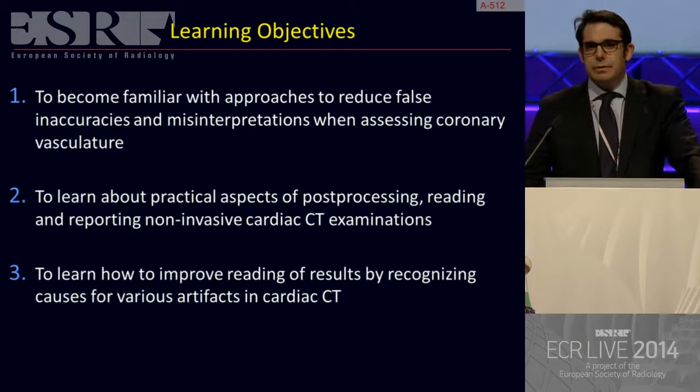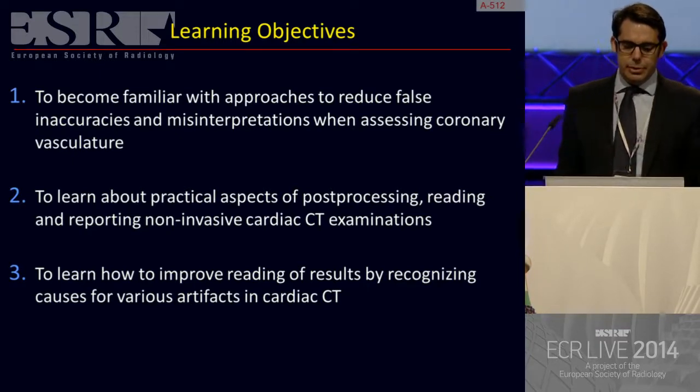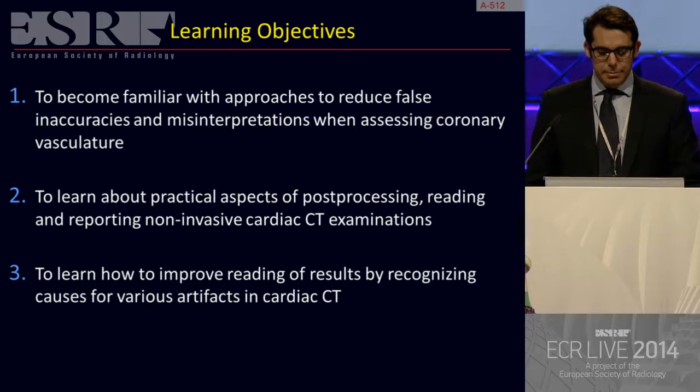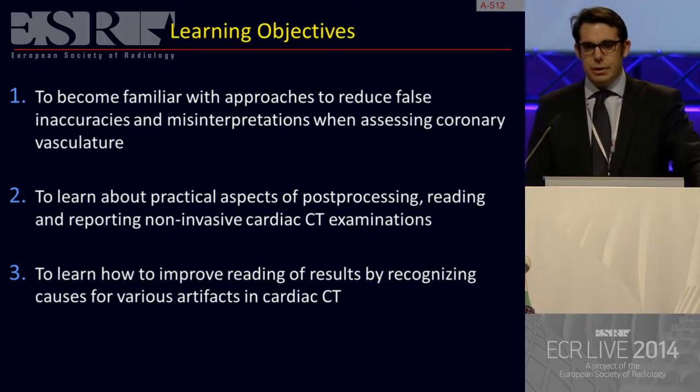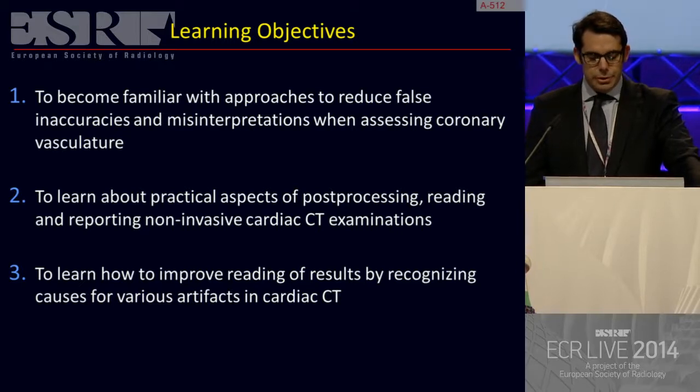The learning objectives of our session would be to become familiar with approaches to reduce false inaccuracies and misinterpretation when assessing coronary vasculature. We will learn about practical aspects of post-processing, reading, and reporting non-invasive cardiac CT exams, and we will learn how to improve reading of results by recognizing causes for various artifacts in cardiac CT.